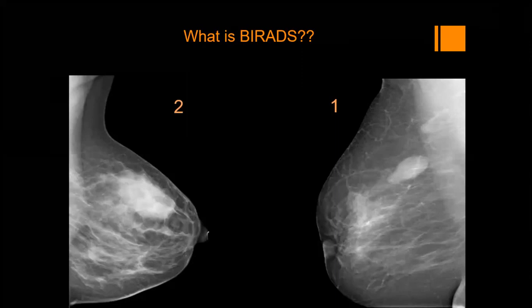At the end, you see, previously these were reported as BI-RADS 3. But recently they said a probably benign lesion, if it is palpable, is upgraded to BI-RADS 4A, unless the ultrasound shows a typical fibroadenoma. And this lesion was a fibroadenoma on ultrasound.